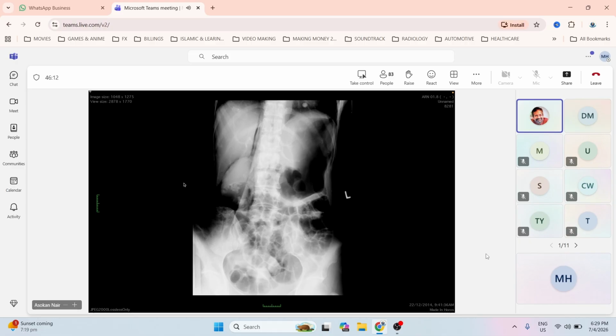Then you look at the rectum. Maybe there's a diverticulum close to the rectum near the sigmoid that perforated, or a diverticulum of the ascending or descending colon that perforated into the posterior peritoneum. You look also around the duodenum. Maybe it's a perforated ulcer. So this is why it's so important to know the anatomy and what the retroperitoneal structures are when you see air in the retroperitoneum.